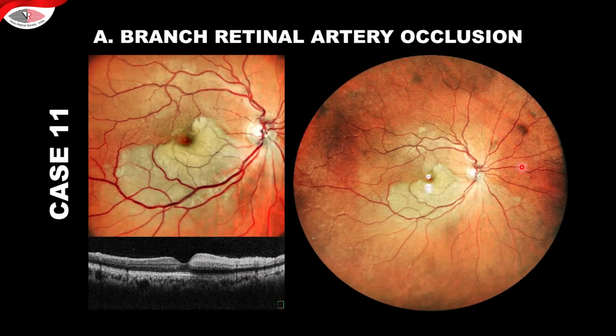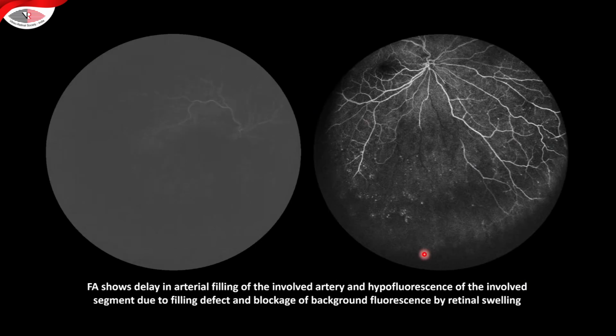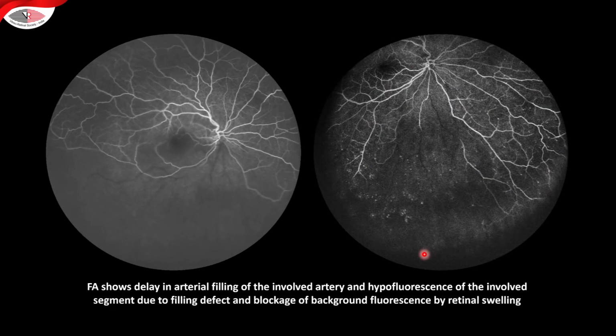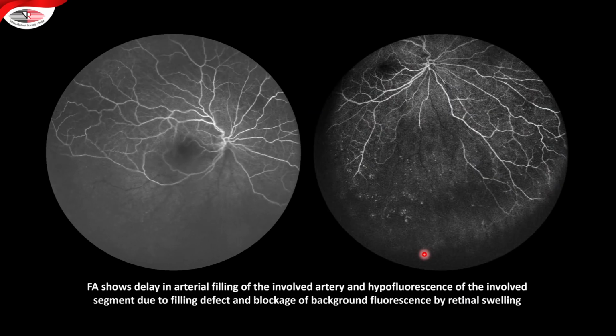So this is a branch retinal artery occlusion. You see a geographic cutoff very clearly seen. They will always take a geographic horizontal cutoff, these arterial occlusions. The OCT will show you a lack of differentiation of retina in the affected half as compared to the normal half. And when you do the angiogram, you'll see sometimes a delayed filling or a total lack of filling in that area based on how the reperfusion has happened post-occlusion. You can see that quite clearly here.